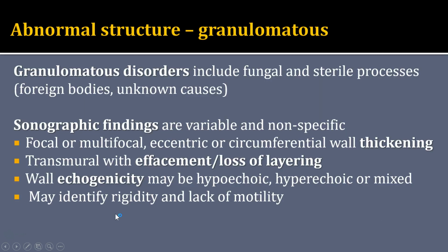Next, let's talk about granulomatous disorders. These may be fungal, such as histoplasmosis or pythiosis, phycomycosis, among the more common fungal disorders. But you can also have sterile granulomatous processes, which could be caused by maybe a chronic foreign body or unknown causes. The ultrasound findings are variable and very nonspecific. Again, most ultrasound findings are nonspecific, and we need to biopsy.